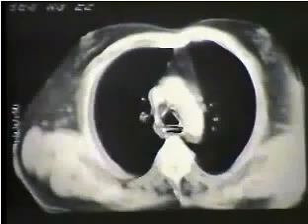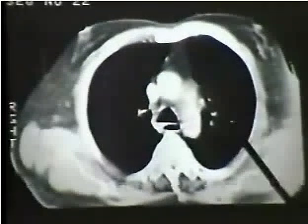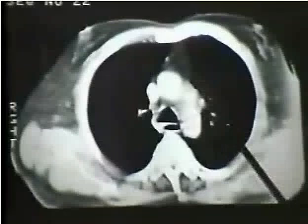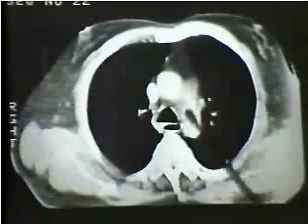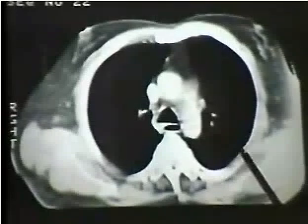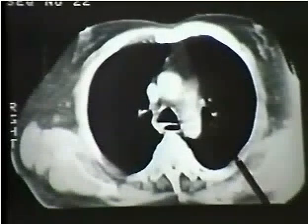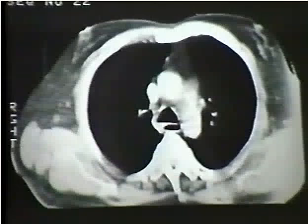Let's go down one cut. Here we are beginning to clip the top of the pulmonary artery, the left pulmonary artery here. This patient does not have much of an AP window, but we don't see a discrete mass. We see, however, border forming is a continuation of that vascular structure we saw before. If you go down further, this is lost in the shadow of the pulmonary artery, just as it was on the chest film. Well, that must be a vascular structure.